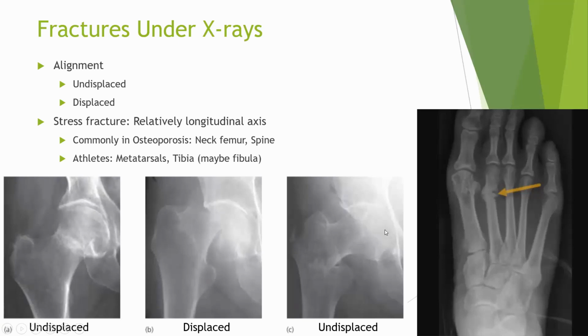And over here, probably it is difficult for you to notice, but with a keen eye, you will be able to. Look at this dark line passing through, a faint dark line from here to here. Follow my cursor right over here. This is an undisplaced intertrochanteric fracture. From the lesser trochanter to the greater trochanter, this line is extending, and that is an intertrochanteric fracture.